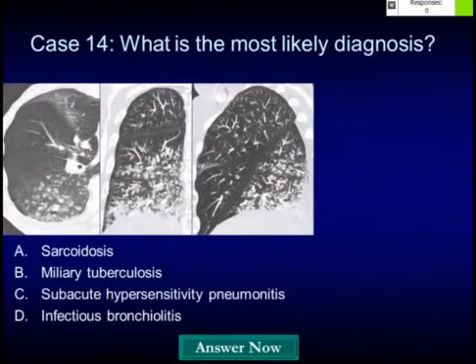All right, the next case, please go ahead and vote. All from the same patient.